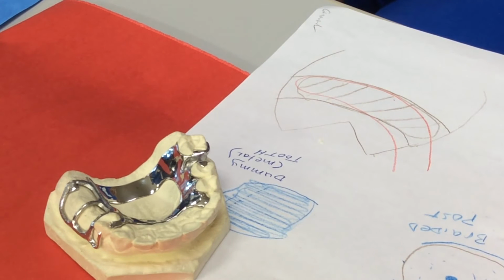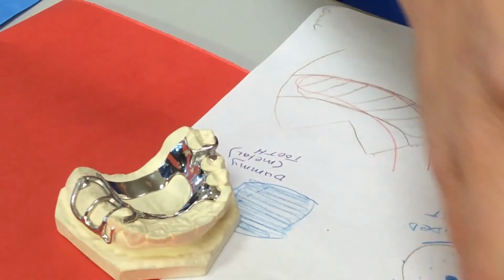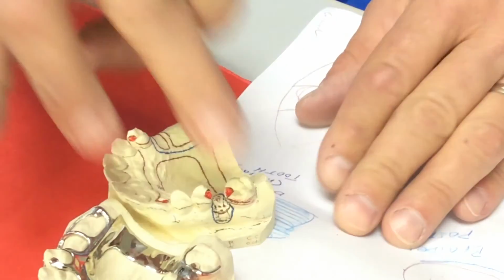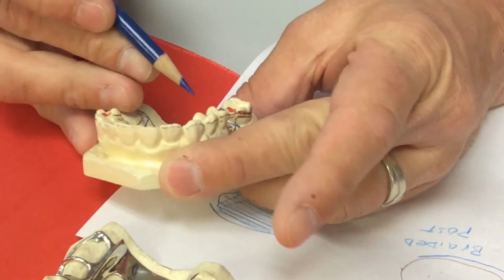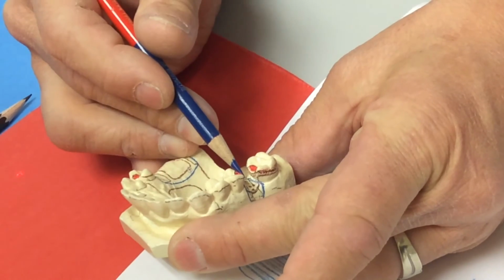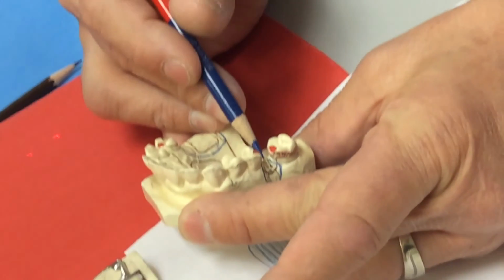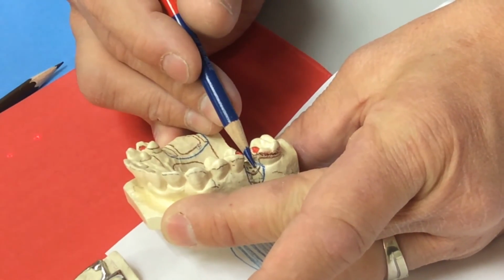Is the dummy tooth attached to the guide plates on each side? It's all cast as part of that framework. So it would be part of your guide plates, yes. So how do you draw that? Do you draw the guide plates extending down to the circle? You're going to draw it the exact same way that you draw the guide plates, but when you're drawing your drawing, look at this one. You would do exactly the same as everything, except you would just color this all in as a blue cube. Okay? So instead of having beads, instead of having a post, you would still have the internal finish line. You're still going to have the external finish line.